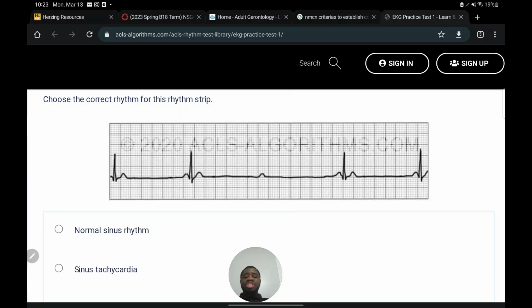Here the husband, wife and child are intact, but here the wife and kid leave the husband. So we only have P waves, and this seems like a block. There is no ventricular contraction because the QRS complex is absent. So there's a block here.